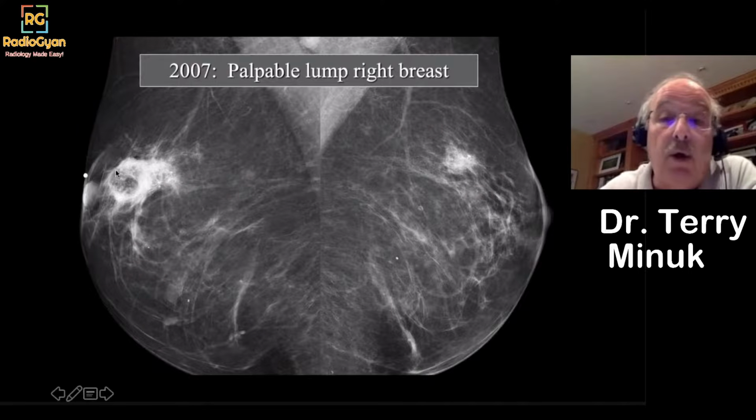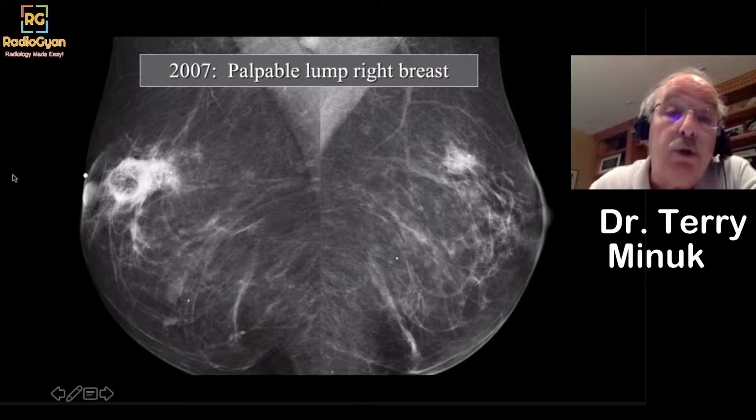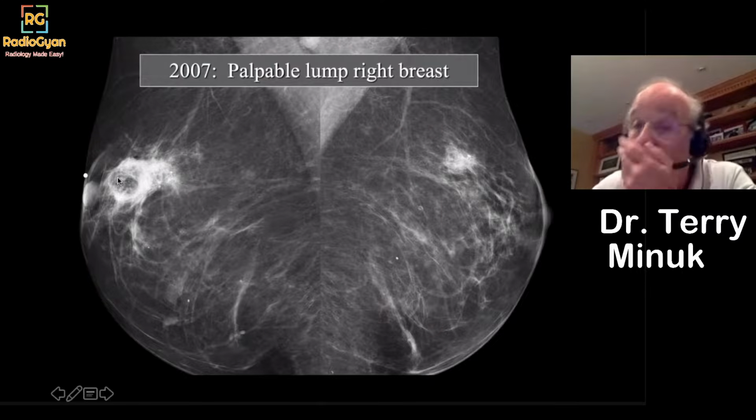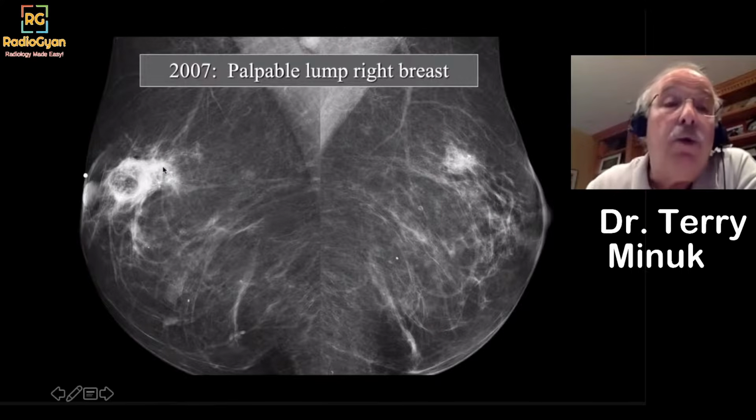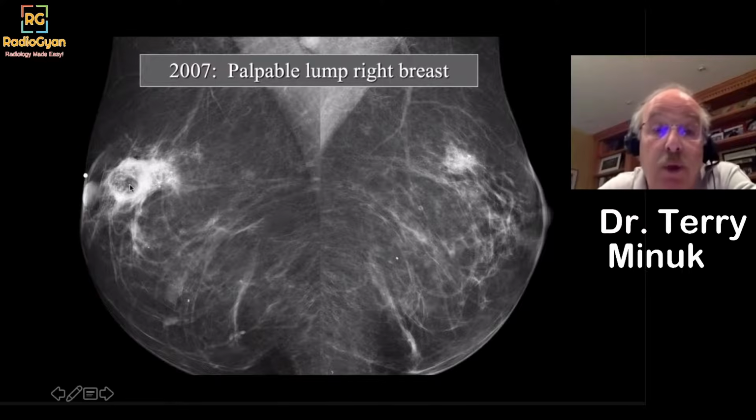So you tend to get a lot of fat necrosis behind the nipple. And sometimes after surgery, there's nothing palpable. But a year later, 2 years later, excuse me, you get a fibrous rind around the fat necrosis behind the nipple, and it becomes palpable. But often within the fat necrosis, you get calcifications.